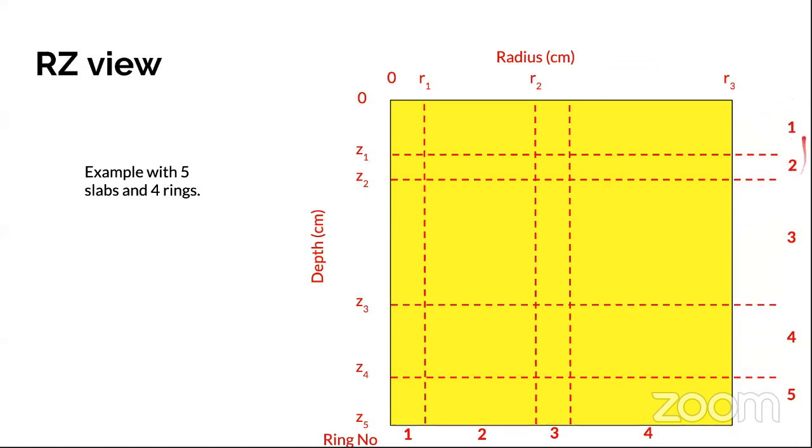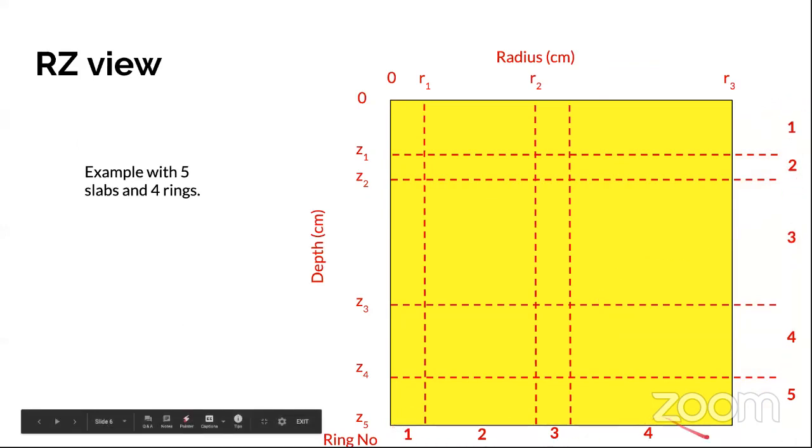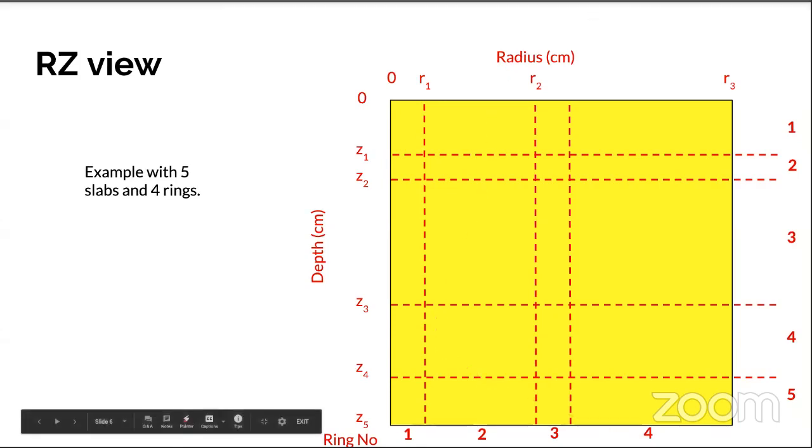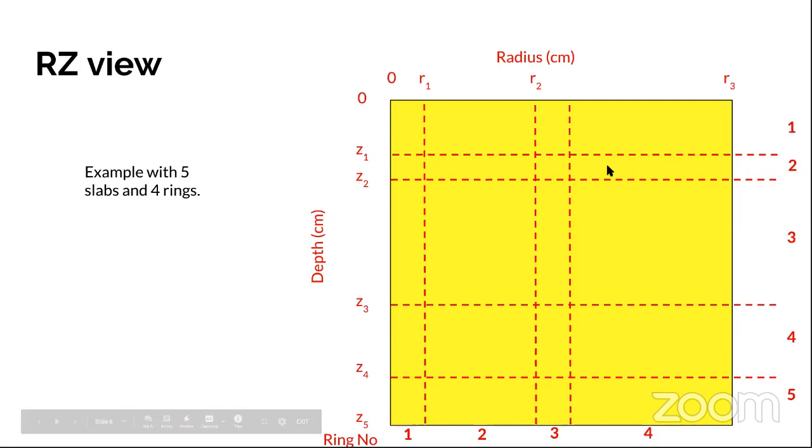This is the planar zones, and these will represent the 1, 2, 3, 4 ring zones. So now we have defined our geometry. Okay, we have defined our geometry. The next step, so this is not enough. The next step is we need to define or insert the medium in each one of these zones or regions.